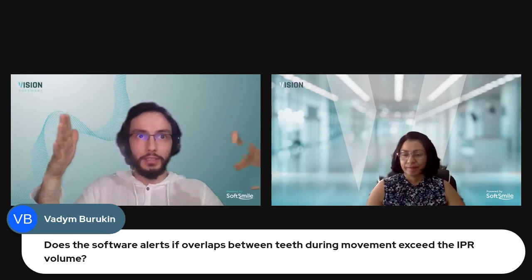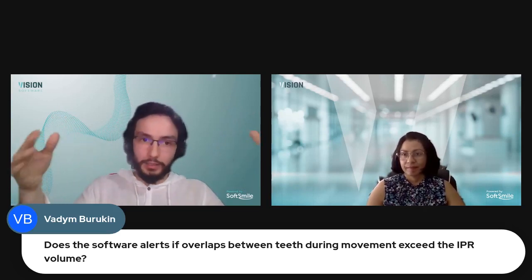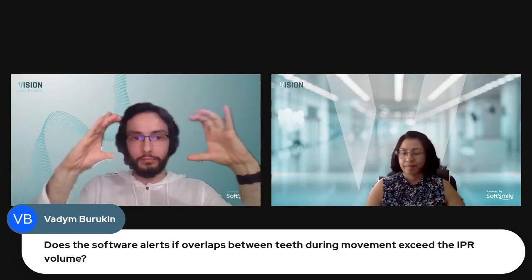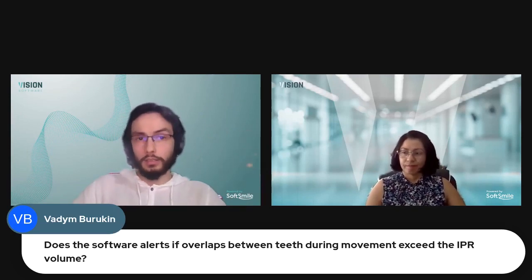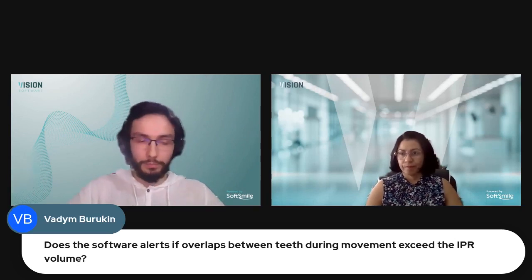And if the system sees that your IPR or the necessary IPR exceeds that threshold, the system is going to give you that red box saying, hey, no, that exceeds the IPR value. And of course, this threshold is configurable, so you can change it to your protocol.